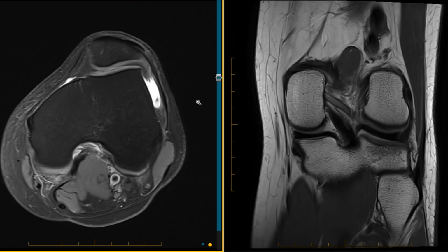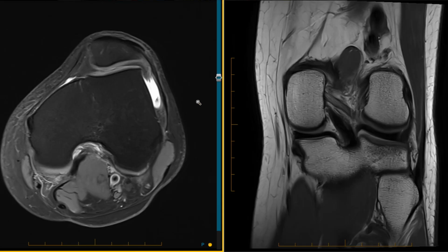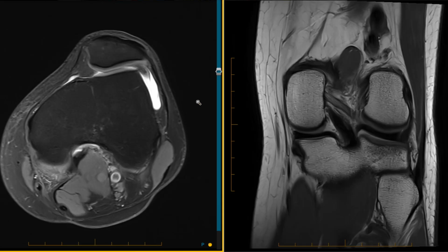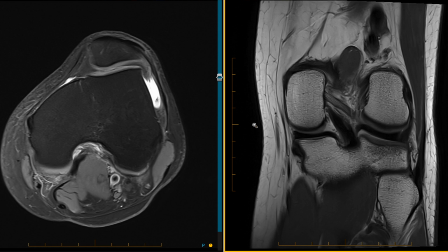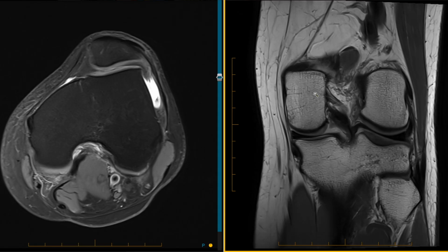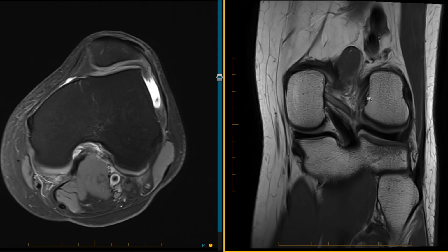This is a video to assess femoral attachment integrity in the cases of ACL rupture that we're using for the classification system. So I'll start with first a case where the femoral attachment of the ACL is nicely intact. Here we see the rupture zone, which is in the upper segment of the ACL, but the femoral footprint of the ACL still remains attached.